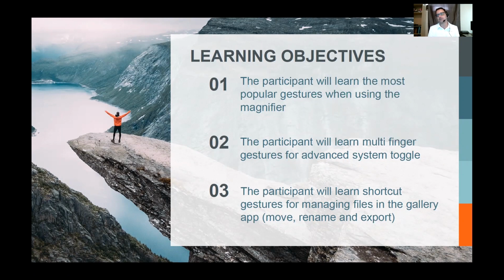We have three learning objectives. The participant will learn the most popular gestures when using the magnifier, which is the principal application in the Connect 12 or the Reveal 16i.